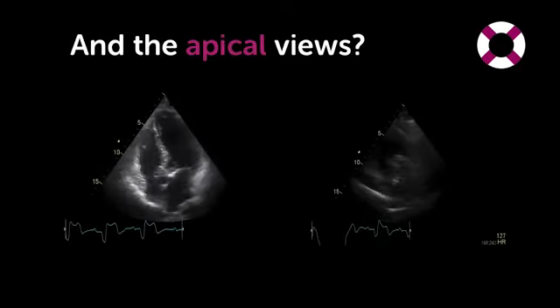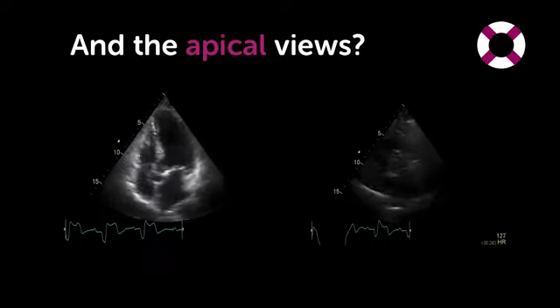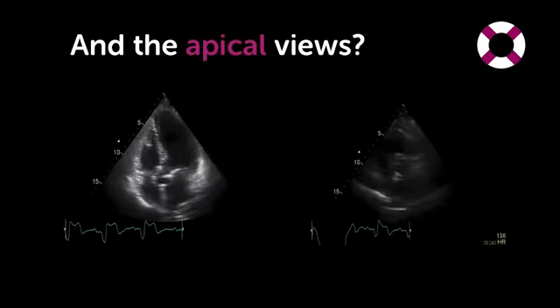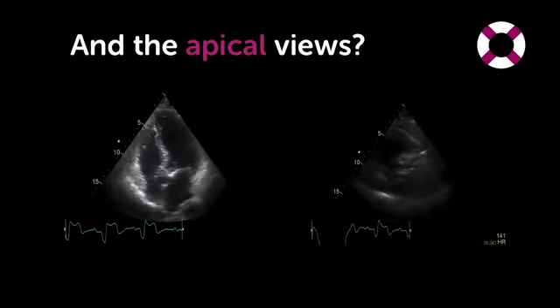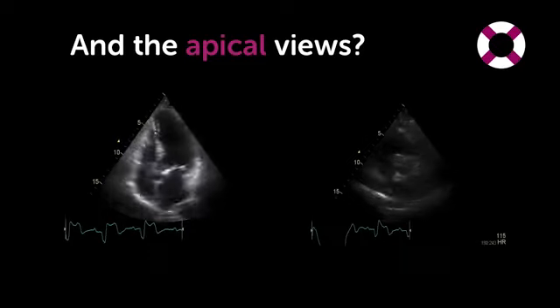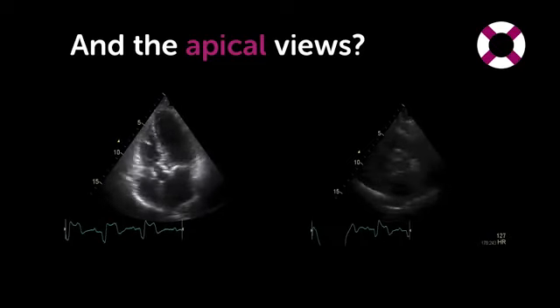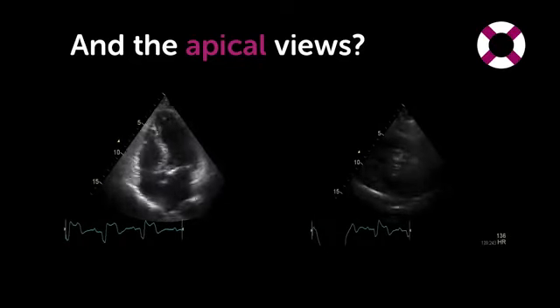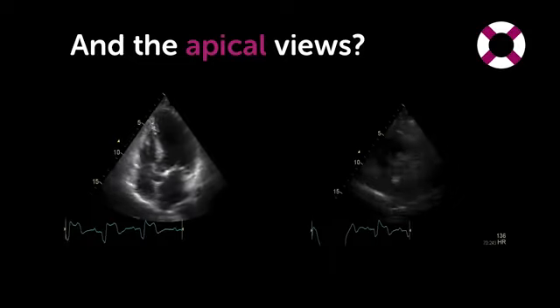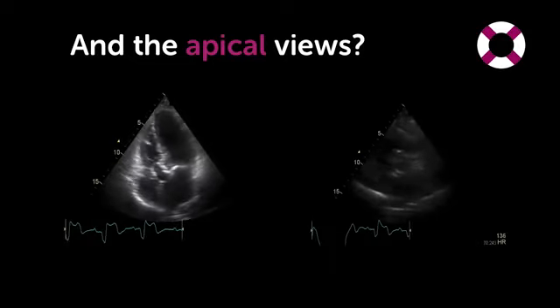One more issue related to the morphology of the aortic valve. What happens if we cannot get a parasternal short axis view? Can we use the apical views, specifically the 5-chamber view? You can, however, you must consider that the aortic valve looks usually more calcified in an apical view. This has to do with the fact that we're hitting the valve parallel and therefore there's more reflection and the valve appears brighter.